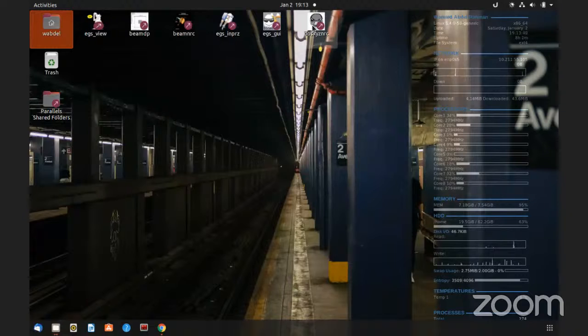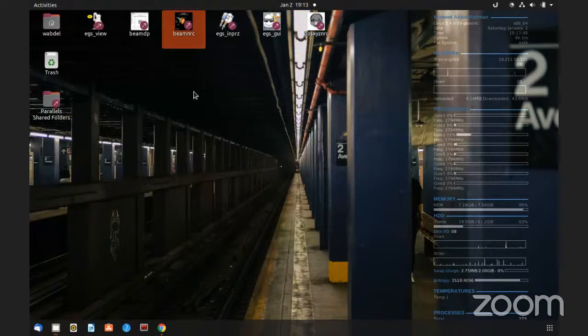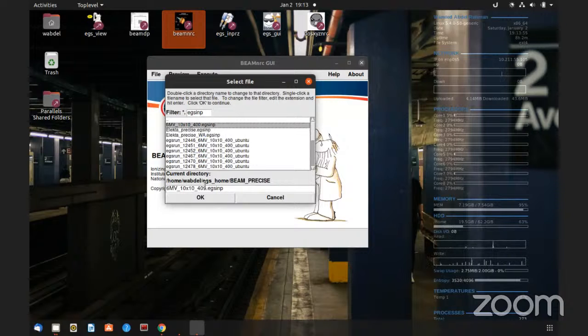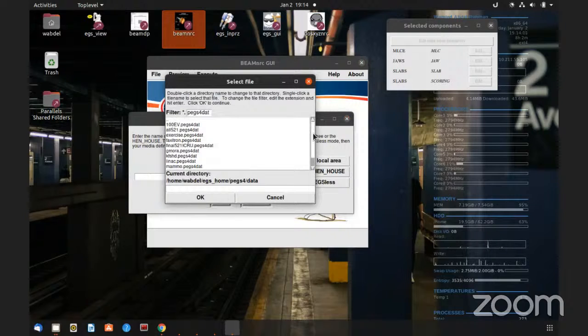Yes, sir. I have a question here in the beam energy. Beam energy. Okay. You want me to open the model? Yes, sir. Precise. Yeah, that one. Okay, I have this one. This is actually your file that I just modified a little bit. Okay, what do you want to ask about?